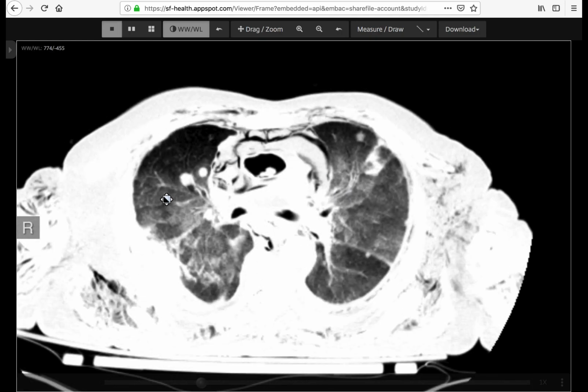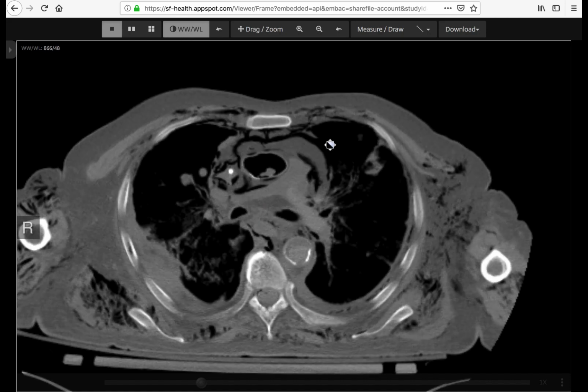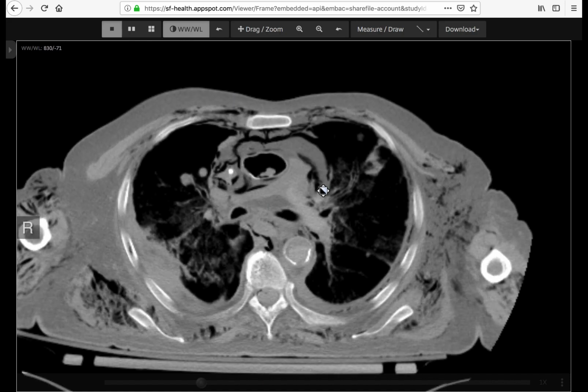If you get way off course, like down here, remember you can just click this back arrow, and it will return you to the default soft tissue windows, 450/50. So don't be afraid to experiment with this.